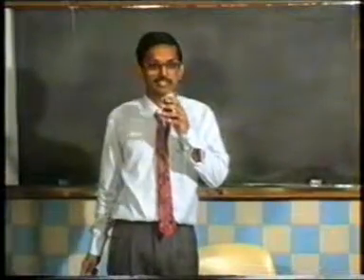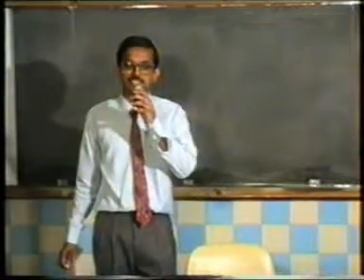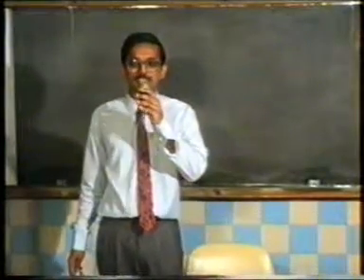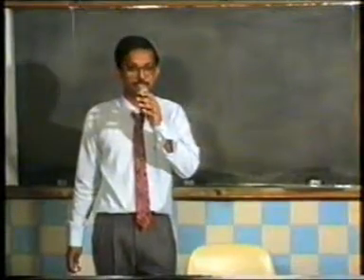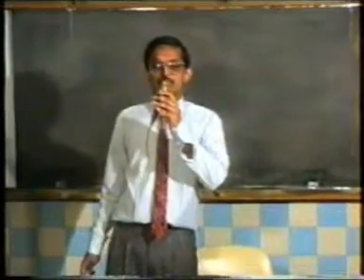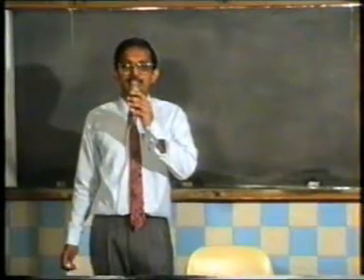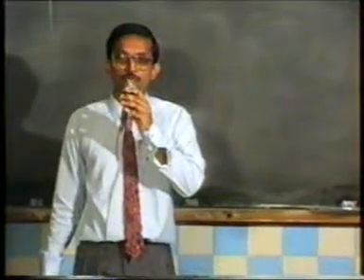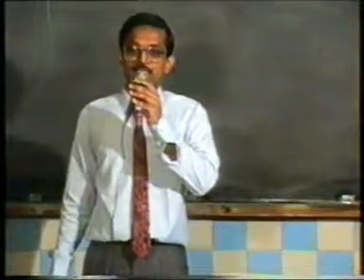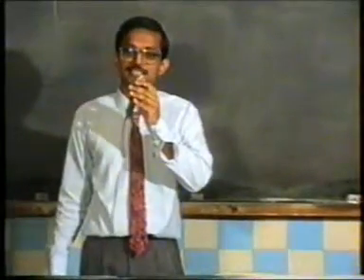As we've seen in the previous X-rays, the petrous apex of the temporal bone comes in the way of the maxillary sinuses, and because of this reason we cannot comment on the condition of the maxillary sinus in Caldwell's view. So a modification of this is known as Waters view, also known as occipitomental view. Here the patient's head is tilted in such a manner that the petrous apex now falls below the maxillary sinus, thus clearing all the obstacles in front of it. And in this view we can clearly see the maxillary sinus, and any disease is detected at its earliest.